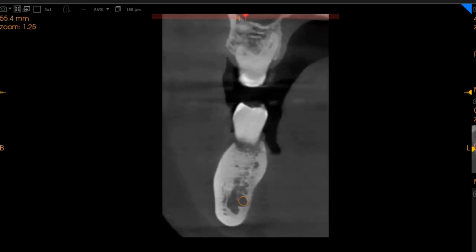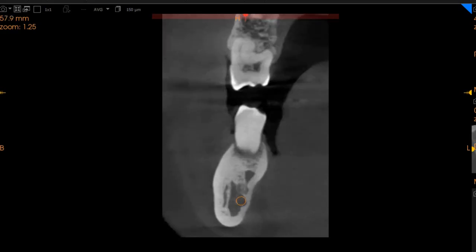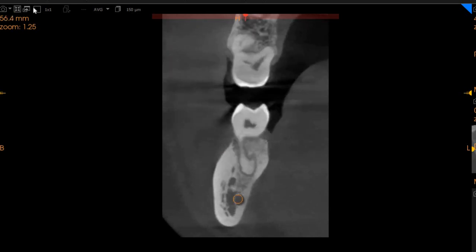And in the region of the 7, the mesial root definitely shows some form of radiolucency. It could be periodontal disease or due to occlusal trauma. We do see PDL widening right here. And if this tooth is to be extracted for any reason, the ridge width at the furcation area is approximately 9 millimeters with 15 millimeters of height and good D1 to D2 quality bone.